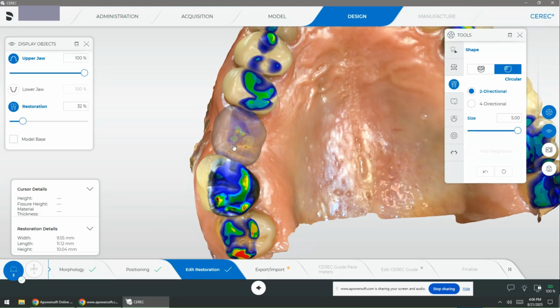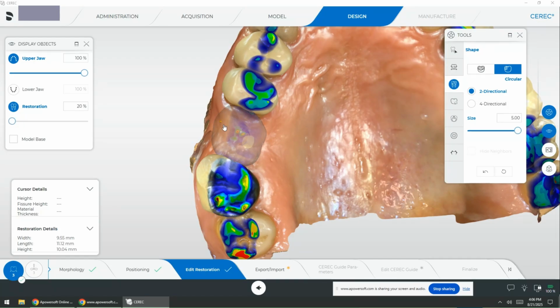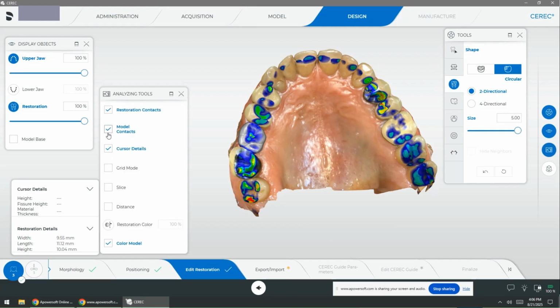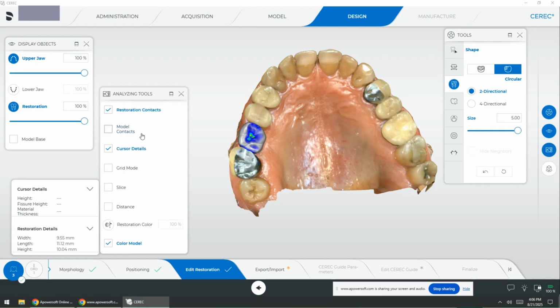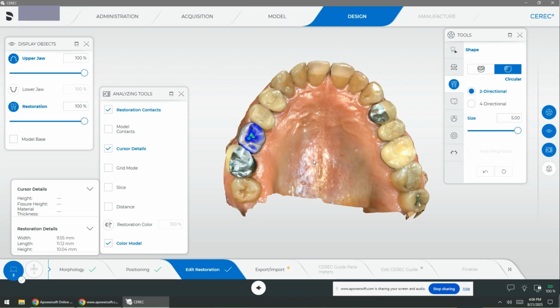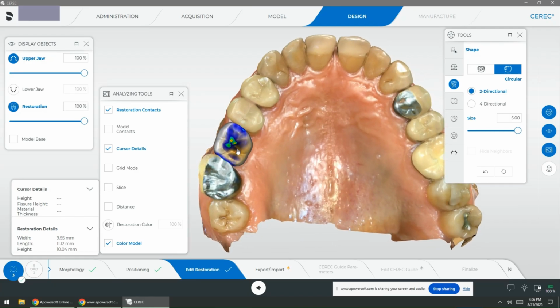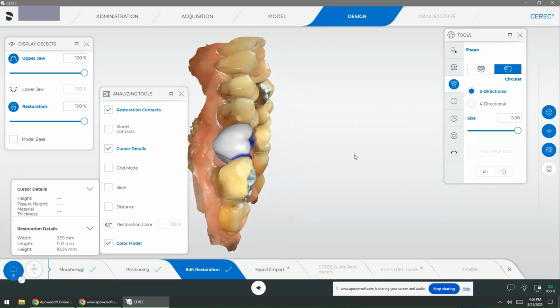The best way to do that is to go into CEREC and put your scans in and then do what is called prosthetic planning, or you can even just place a tooth in a position of where that space is, draw your own margin, and plan the tooth to see where the occlusal forces are relative to the opposing dentition. Again, we want to do this implant planning with the occlusal data in mind.